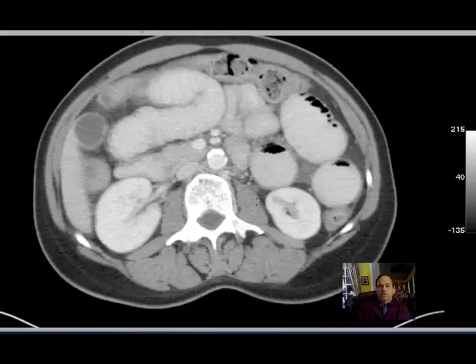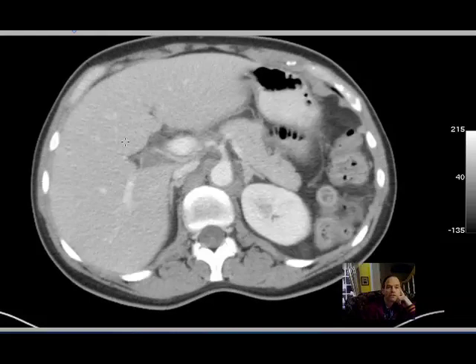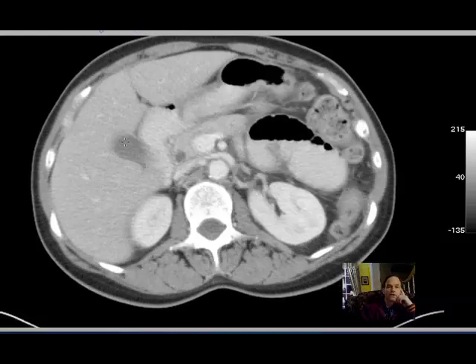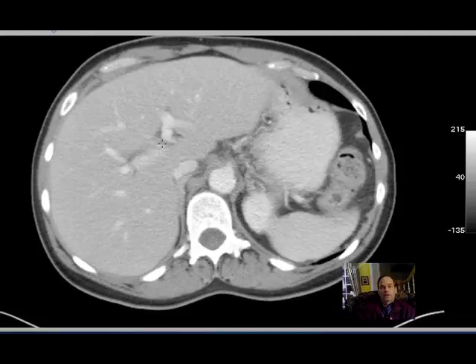Ascites, small bowel obstruction. Oh, what do we have here? Well, this structure here is the gallbladder. We don't usually make too many diagnoses there. Once in a while we'll pick up some stones. Ultrasound is far better in evaluation of the gallbladder. But here we have the common bile duct coming from the liver. So the liver has a biliary system.